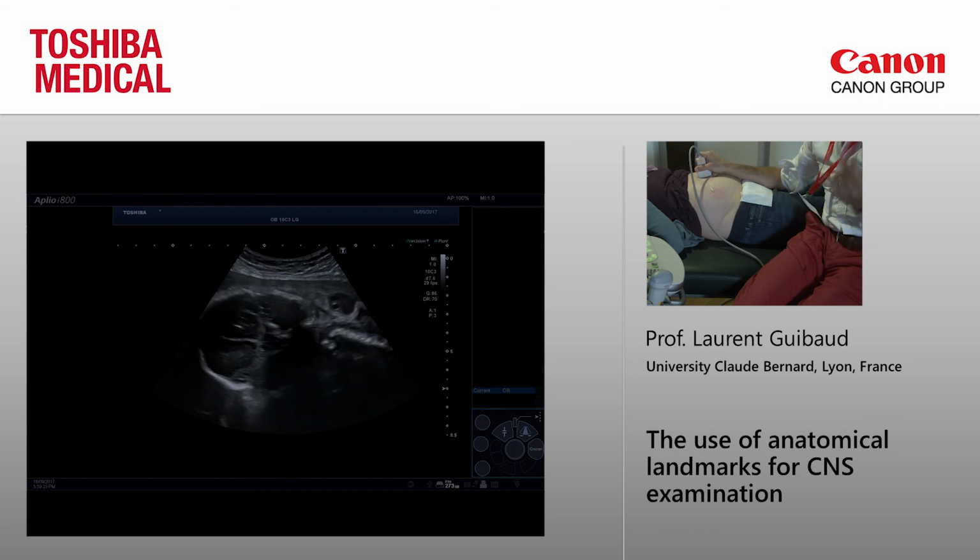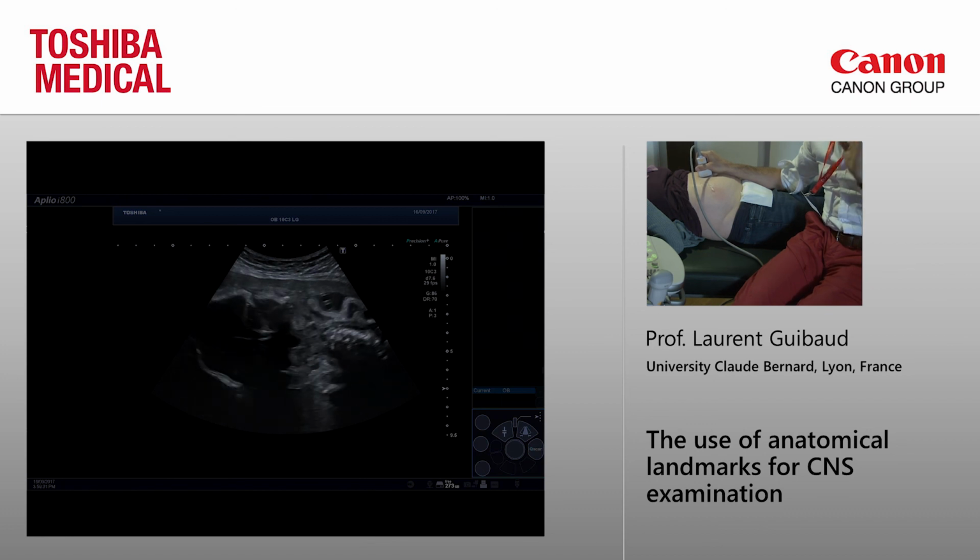So you have to see the two sulci and the bulbs on the two sides to be sure that all is normal. To do that with ultrasound, for me it's impossible. You can see one or two sulci, but you will not see the bulb. And if you see two sulci, you can have CHARGE without any bulbs, and this is not identified with ultrasound, but only with MR.